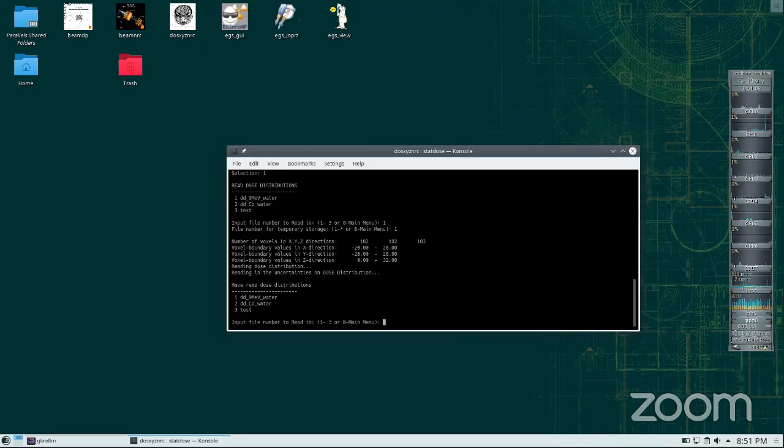We cannot define 2 beams, remember; we cannot define 2 sources. We define only 1 source, either from the top or on the side. Now I can read the distribution from the beam coming from the top, the distribution from the beam coming from the side, and then add them here. So I can read distribution 2 and then add it or do whatever I want.